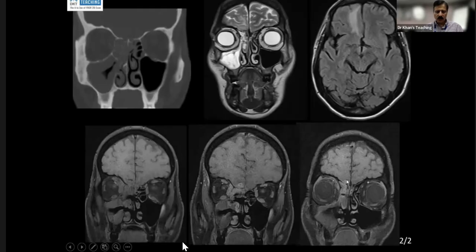So this is dural enhancement, and there is edema on the FLAIR. You can use the word cerebritis if you want for this with dural involvement. So this is a classical case which tells you about a few complications, but subperiosteal abscess is a very important case in your day-to-day practice as well as in your exam.